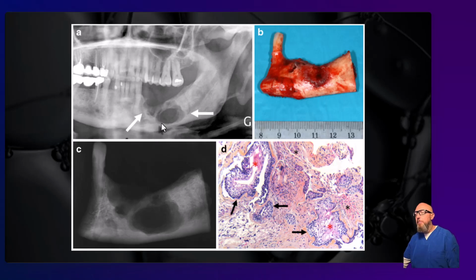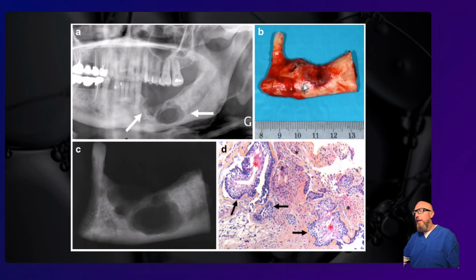What's the expansion pattern like? Well, that's a little bit hard to say. The specimen here shows you a little bit about the expansion. It is expanding somewhat toward the buccal, and imagine it expanding toward the lingual a little bit as well. And so what are some of the things on your list? Does it look multilocular as opposed to unilocular? I would say, yeah, there's a little hint of loculations here. And so think of our MACHO acronym. What's that? Myxoma, ameloblastoma, CGCG, hemangioma, and OKC.